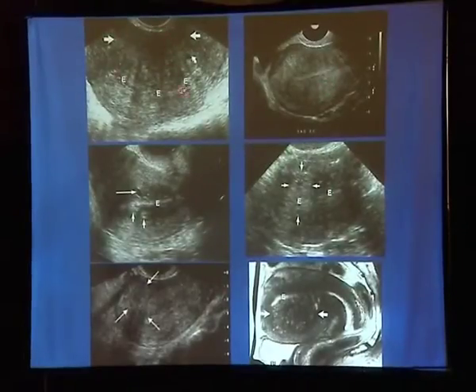You have asymmetric thickening of the wall. The anterior wall is much thicker than the posterior wall. It's heterogeneous, with patchy areas of hypointensity. And if you find these fine lines coming like this, and with poor penetration, think about adenomyosis.